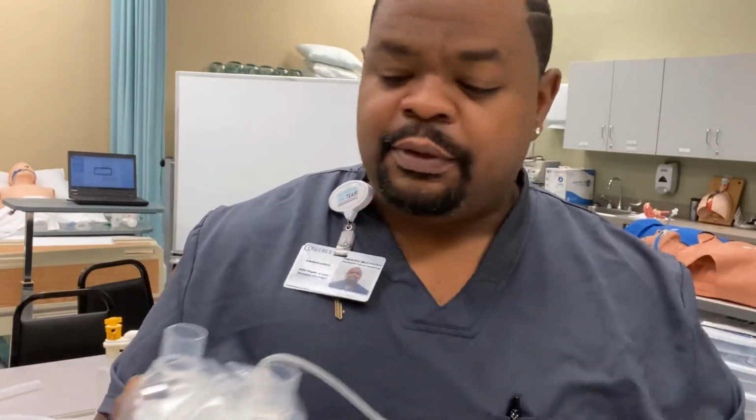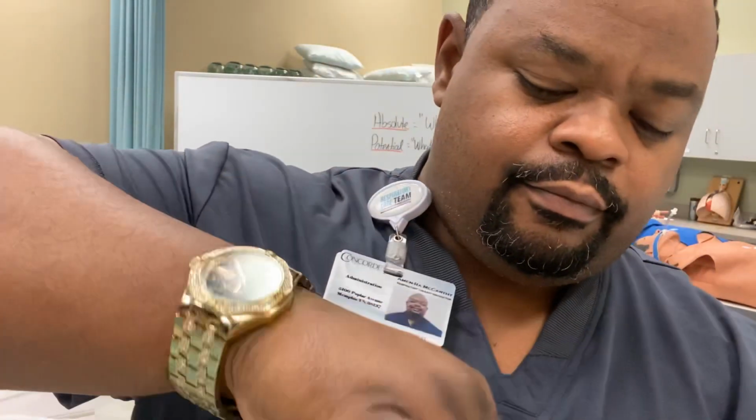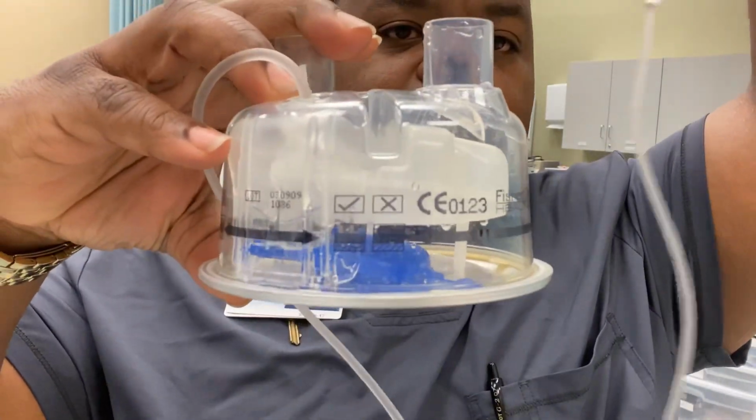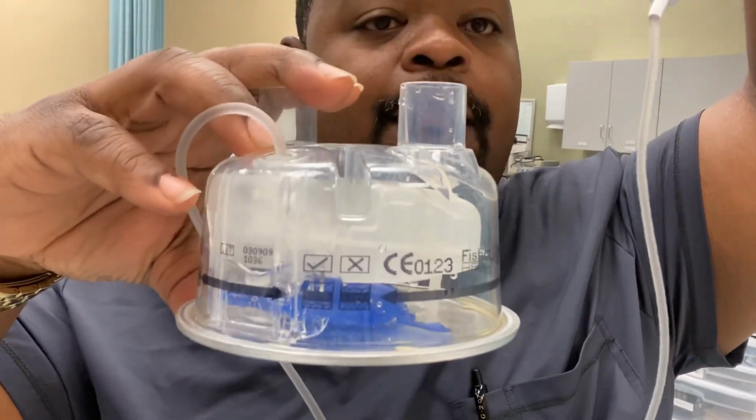Same thing. But you'll notice it has this little feeder apparatus, right? All it does is poke down into your water bag, okay? So I would put this into the water bag, right? Lift it up, and you'll notice water going into here. See that? This is what the water comes from.